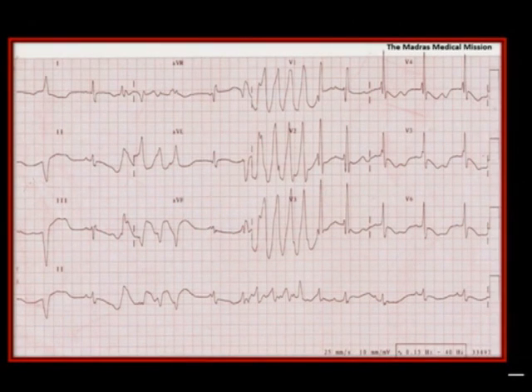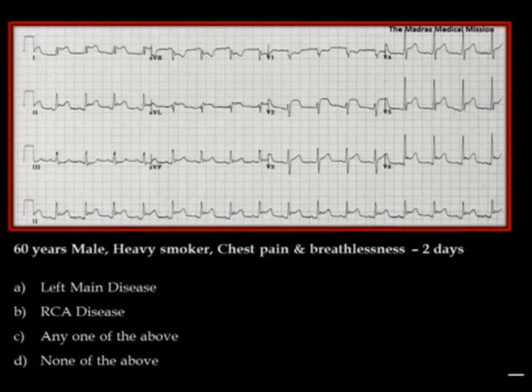Ramakrishnan, should I stop? So that was important to recognize that long QT because very quickly you look at whether there are any reversible causes of that long QT, because this patient, before we could evaluate further, has had this episode. Indeed, this patient presented to the emergency because of the syncopal episodes. This probably is my last ECG.